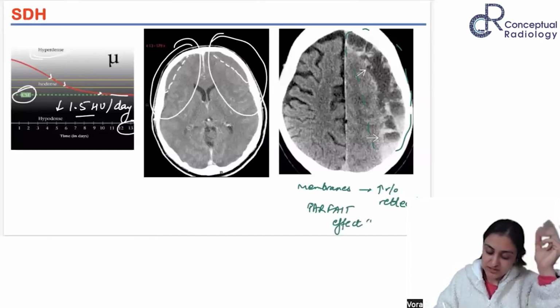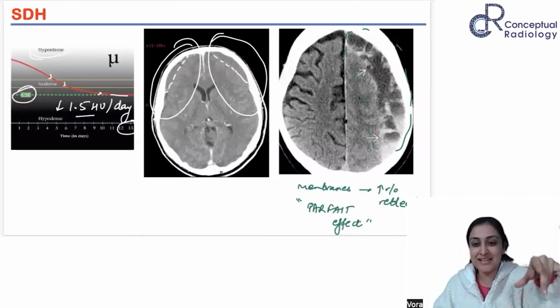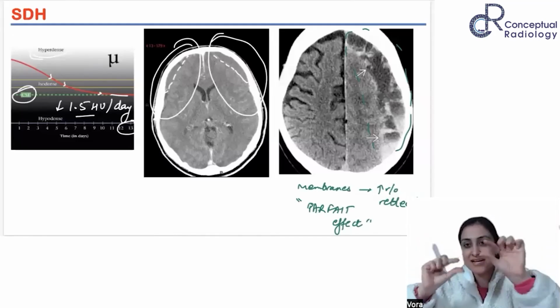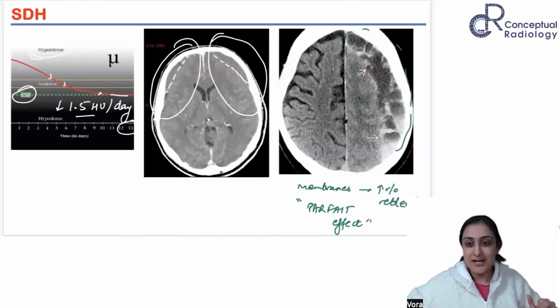It's a dessert with a set custard and jelly, and I don't want to go into the details of parfait, but the hematoma kind of sets and becomes this jelly custard-like consistency, and you will have these pockets. Okay, so this is what we see here.